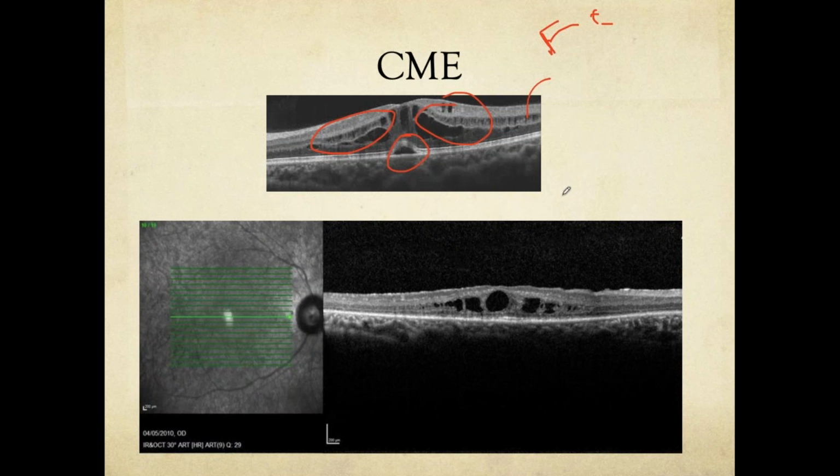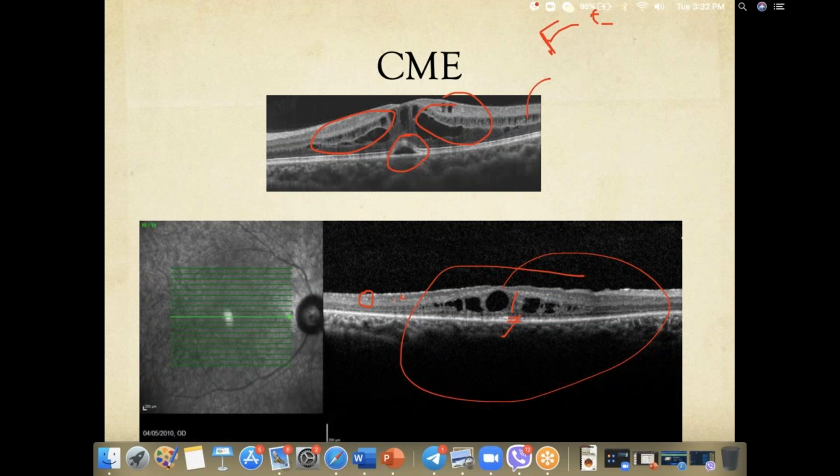So it's multiple pathology. If you take a look at this retina, two layers can be seen. The junction is fine. These lesions, what are these? The two bright white lesions that you can see there, what are they? Can anyone tell me what they are? Anyone?